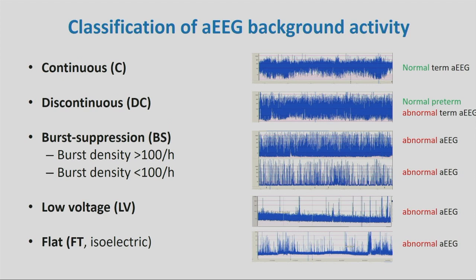And then you have a term which is called burst suppression pattern, which is this, and so you can see a burst and suppression. And this is what we call burst suppression in the aEEG. This is not necessarily the same in the EEG, because to call something burst suppression pattern in EEG, you also want abnormal epileptiform activity in the EEG pattern, which is not necessarily here. You can't see whether something contains epileptiform activity or not. So this is not the same as an EEG burst suppression pattern that we saw in the baby earlier.